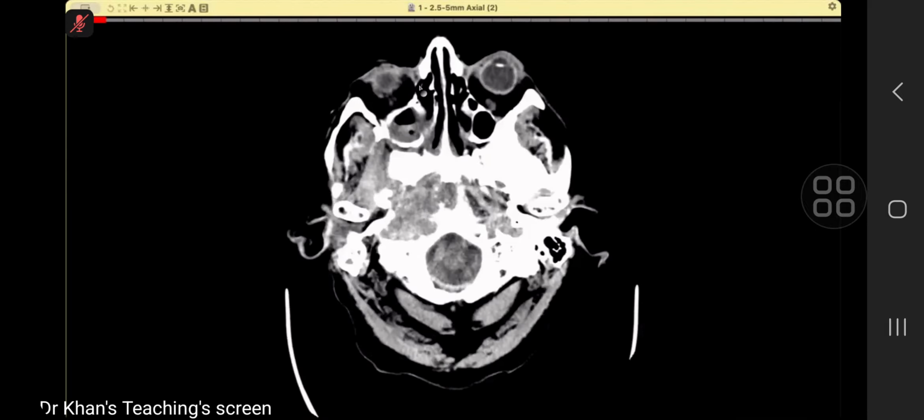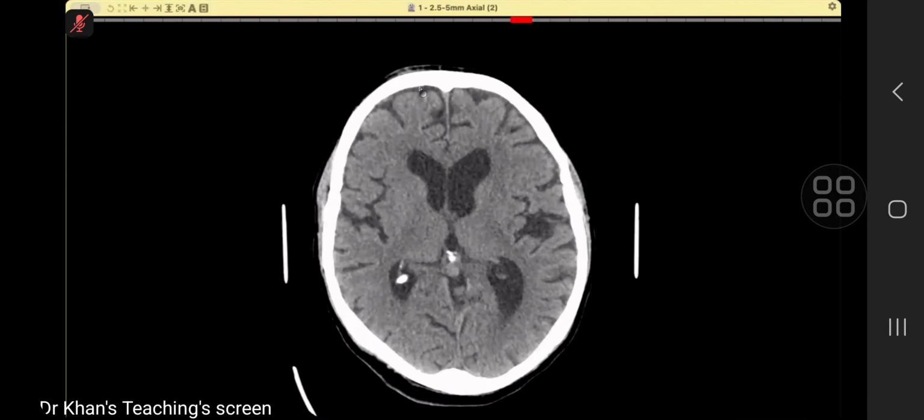Okay, candidate two, are you with us? Yes, hello, sir. Okay, candidate two, this is a 76-year-old female, and once again, stroke. And they did a CT and CTA. Over to you. So just can you ask for the mouse? Yeah, sure. So the mouse is with you.